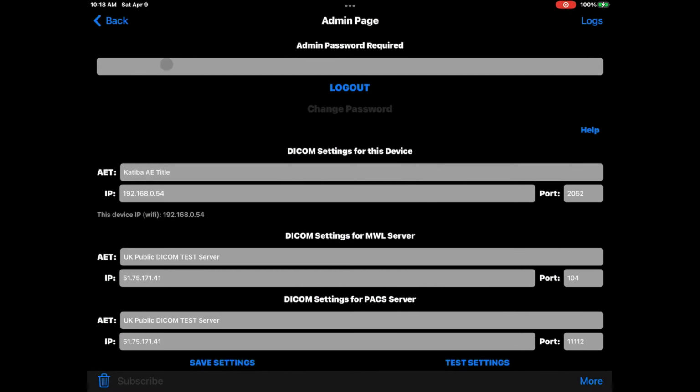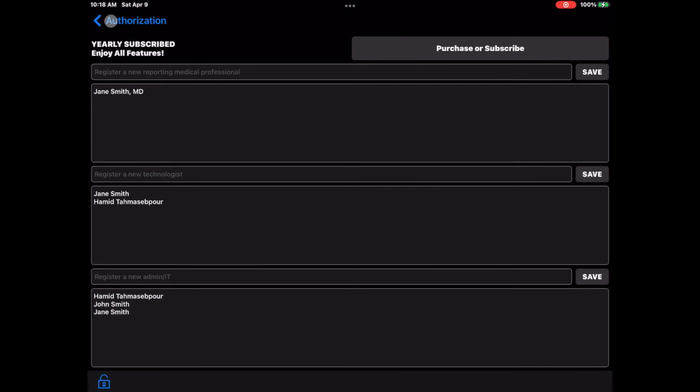Return to Registration page and enter the name of new user in proper field. There are different fields for reporting medical professionals, technologists, and admin or IT staff. Let's register John Smith as a new radiologist. Enter John Smith in the reporting medical professional field exactly as you want it to appear on the report.